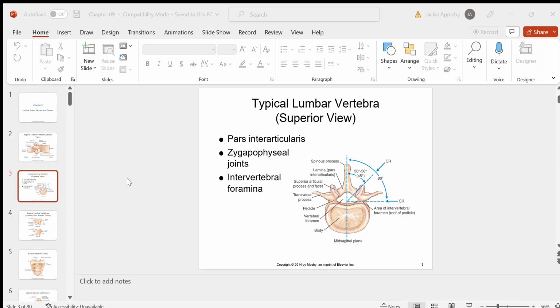45-year-old dad. You know? But you see here that the relative size is very small, right? That's a postage stamp, about an inch by an inch, right? And the coccyx is not much larger than that.